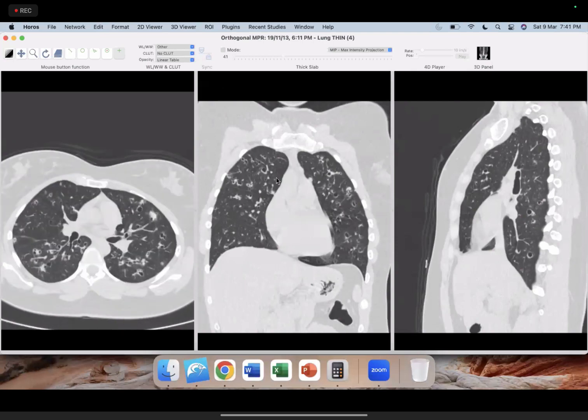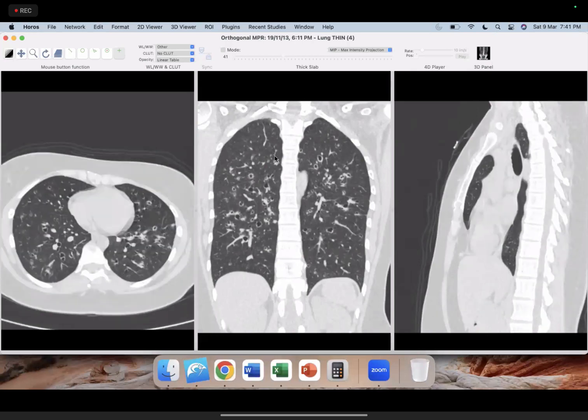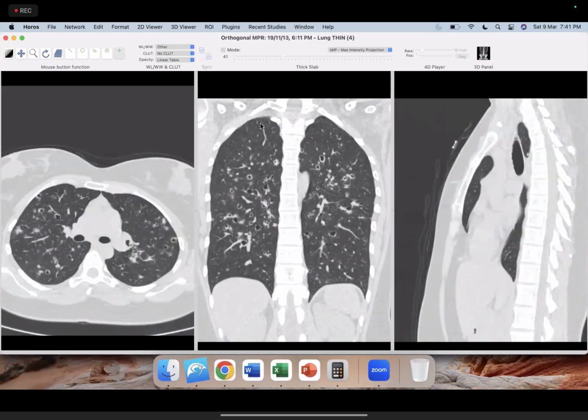So though this patient is a female, remember this diagnosis: you stop thinking about it the moment you see a female, and that's not true. So yes, somebody now correctly asked for a history of smoking. That is more important than the gender. So you can have a female smoker also, with the typical distribution and morphology of a pulmonary Langerhans cell histiocytosis.